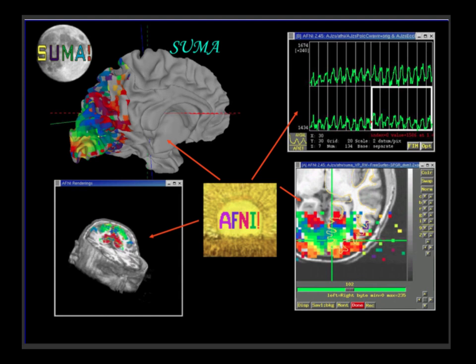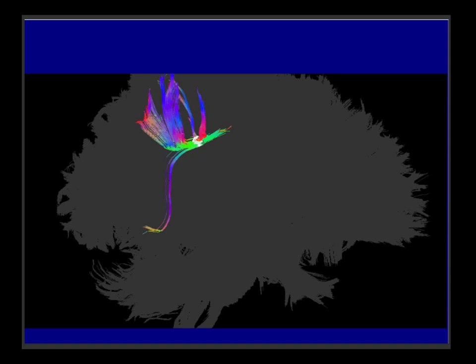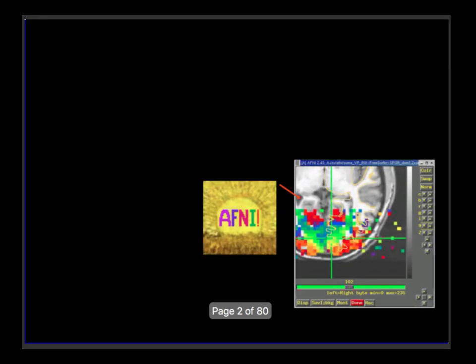This gives a sense of how we can see the same data projected onto the surface. And here it is just slice by slice. So same things, but different representations. We'll see why one's useful. And that's all the way to the end. Okay.